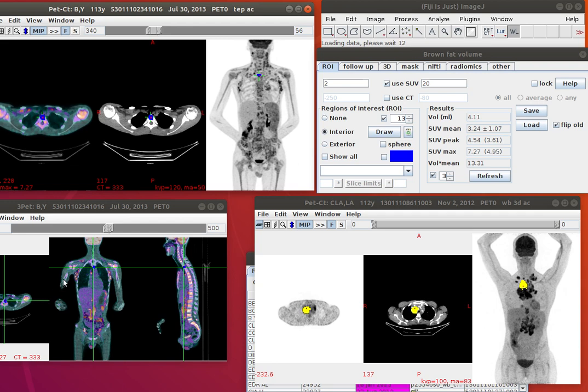But there's something even better. The red dot, there's nothing magic about the red dot. You want to look at the organ at the position you want to look at it, not this red dot business. So I'll turn off this tracking. And I'll go back to this one. And nothing has changed because I've clicked on here and I've turned off the tracking. Now I can go back to here.